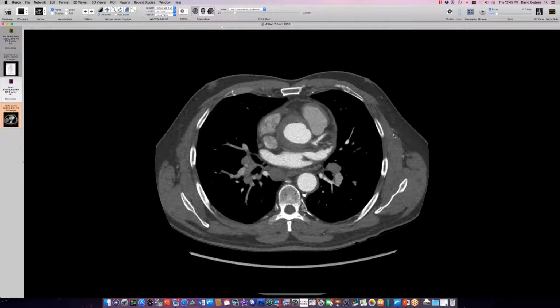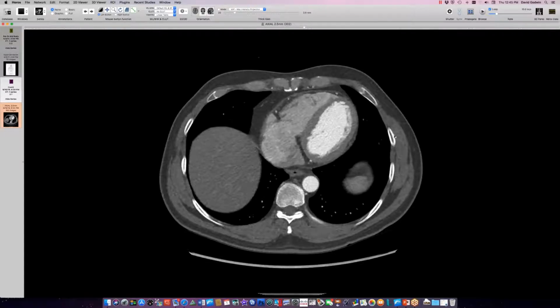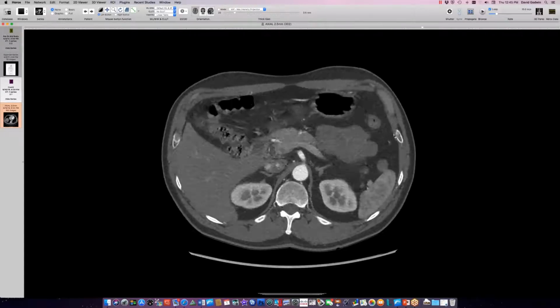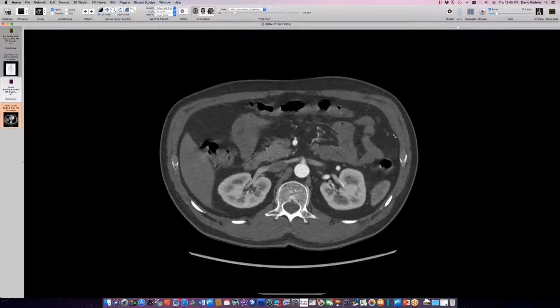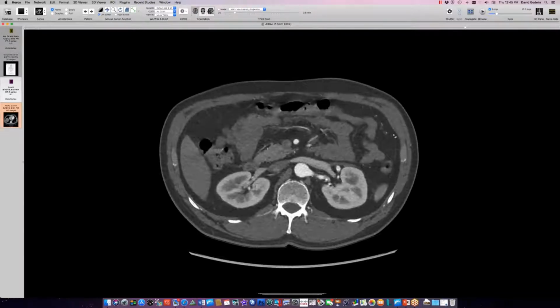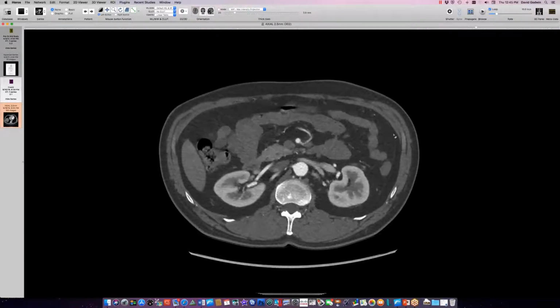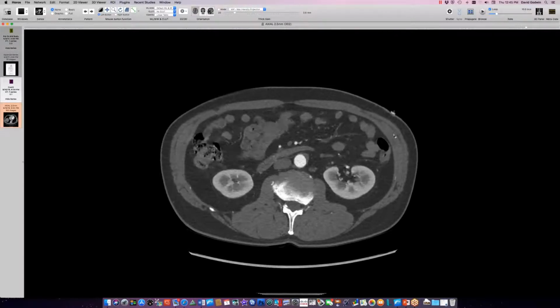So there you go. Wow. If we scroll down, can we look for anything related to, well, kidneys? Sometimes you get renal involvement, occasionally involving coronary. And symptomatically, he does have renal involvement, and he did have an abnormal biopsy. And he's got no extrapleural tissue related to mediastinum, pleural surfaces up higher.